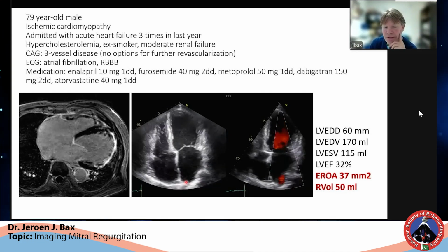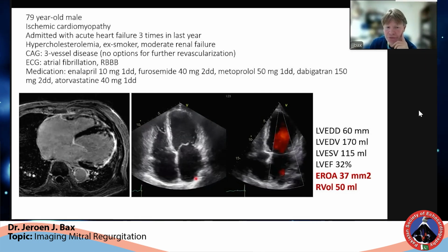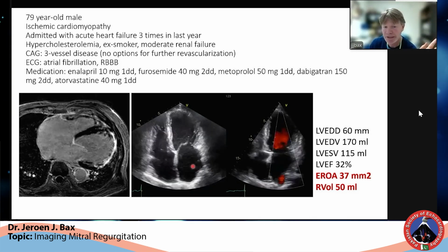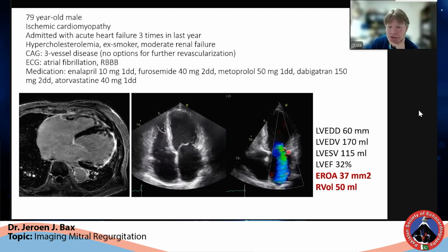Is it in severe AFib? You sometimes see very, very big atria, then this starts to dilate and there comes a regurgitation. We're not talking about that here. We're only talking about ventricular disease. So this is a regurgitation here.